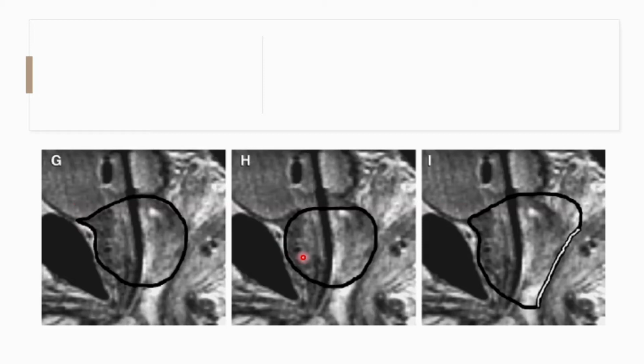Conversely, it is also possible to miss the exact extent of the base of the prostate. Sometimes the base of the prostate projects into the bladder, so it's very important for us to identify this part and contour it in a proper way.